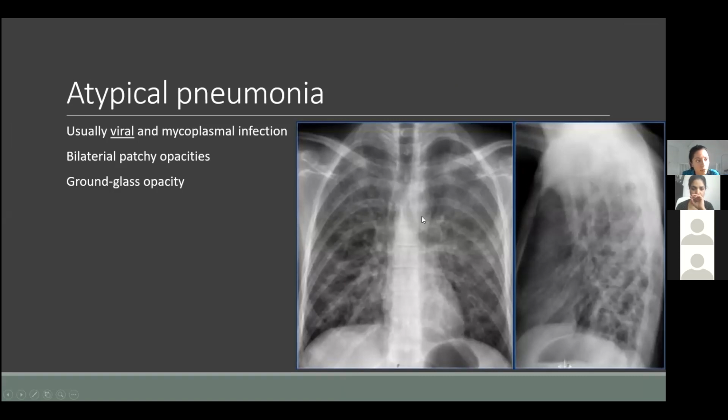I think it's difficult to see subtle signs of fibrosis after COVID-19, but sometimes you might be able to see differences between a post-COVID chest X-ray and a pre-COVID chest X-ray. If you see some thickening, for example thickening of the interstitial spaces, so some lines.